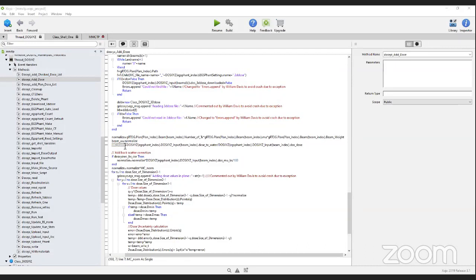Now to go for the Monte Carlo normalization, you have your dose to water value, which we briefly talked about. It's almost always 1 because we're not usually converting dose to water from a Monte Carlo simulation. And then we're dividing by this Monte Carlo normalization value. In my presentation, I thought we were multiplying. So, you don't invert. You just take that value straight up.